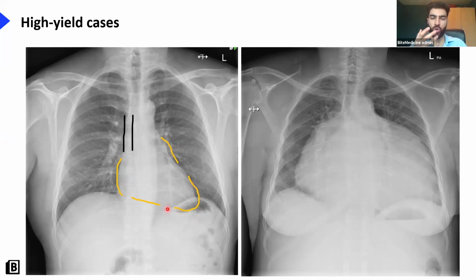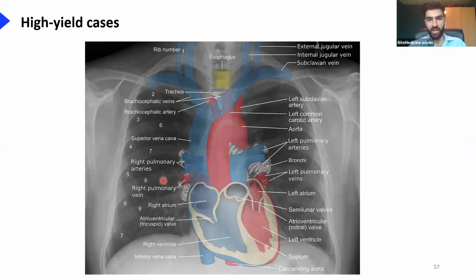It's a bit weirdly orientated in the thorax. That's why the heart's kind of rotated in the chest. That's the aortic arch, and it comes around to give you the aortic knuckle there on the chest x-ray. So the aorta comes out of the left ventricle, wraps round and passes posteriorly down the thorax as the descending aorta. Some basic anatomy. I'm not going to go through this.